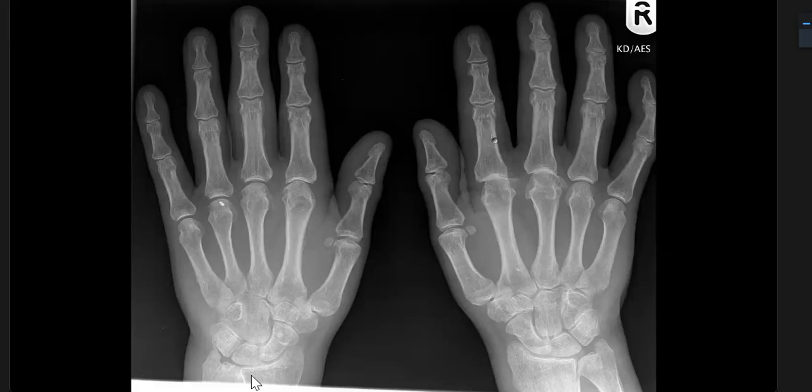What's the next step? I will rule out any abnormalities causing this periosteal reaction. Maybe I'll check if the patient had a CT chest abdomen pelvis to rule out any lung pathology or abdominal pathology.